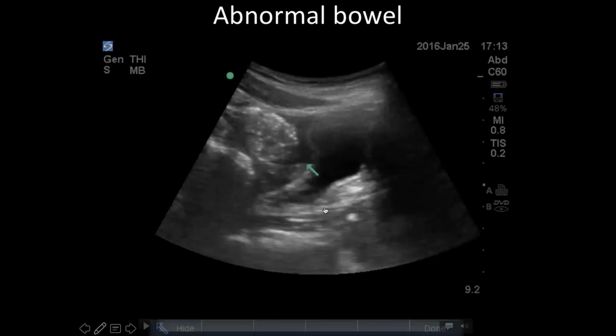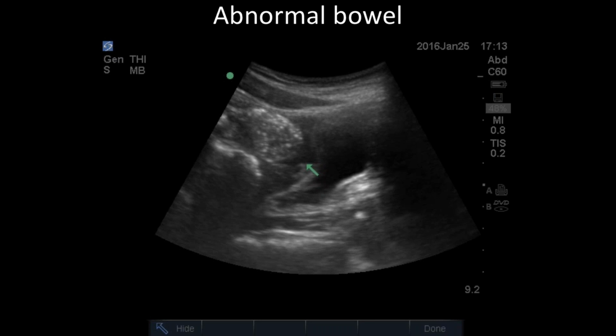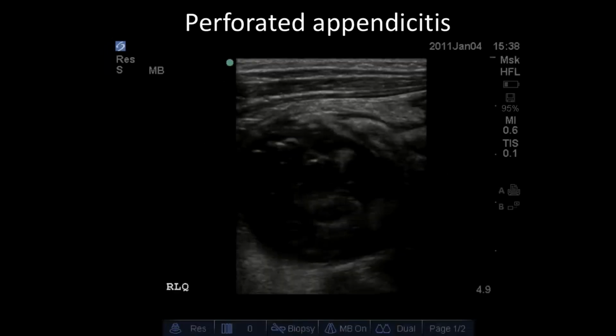This green arrow is pointing to the bowel. And then you go into the sagittal view, and so you see the bladder here. This is the bladder in sagittal view. This is the pubic symphysis with some shadowing down there. And this is bowel here, but right around it, adjacent to both bladder and bowel, is this area of free fluid. So you can see the pointy edges right there, and then this side is kind of outlining the bladder. So the arrow is really pointing to that free fluid. So you've got a dilated loop of bowel with some free fluid in a patient in pain. Although you're not seeing the appendix, this is someone that you want to at least be suspicious about something going on in the abdominal cavity. Which could be, it's not specific for appendicitis, but it certainly could be appendicitis or something else that's irritating abdominal bowel.